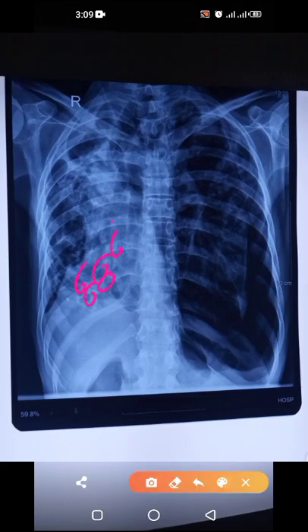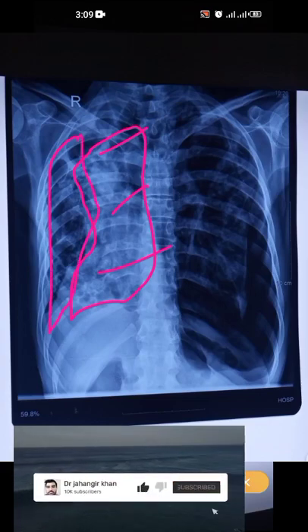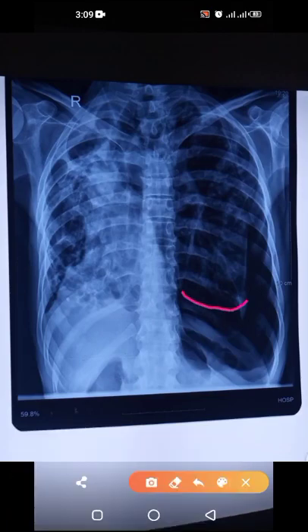Can you appreciate these cystic changes, which are predominantly in the lower zone, with opacification on the medial aspect of the right lung in the upper, middle and lower zone, sparing the periphery on the same side. While on the left side there is a rim of hyperlucent areas predominantly in the mid zone and in the lower zone with no vascular marking and some nodularity. If you focus on this, you can appreciate some nodularity in the left upper zone.